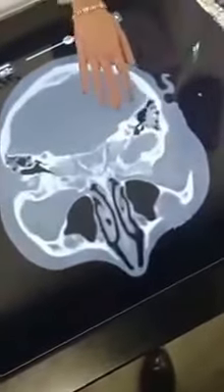And what's most interesting to me is you can load in your own patient's CT or MRI scans, and from there you can get a 3D model of what you're seeing. So here we have a post-operative scan of a patient with a brain aneurysm, and this is the actual CT that was provided. You can go ahead and slide through the CT and see exactly where the clips were placed as well. So if I go down here, it'll show where it is here.